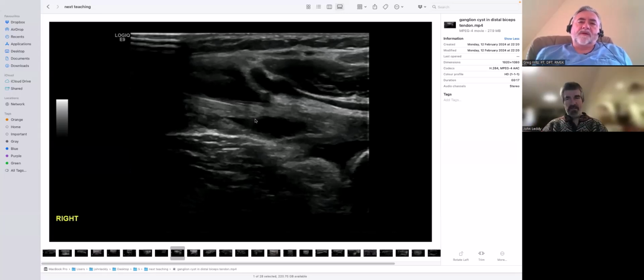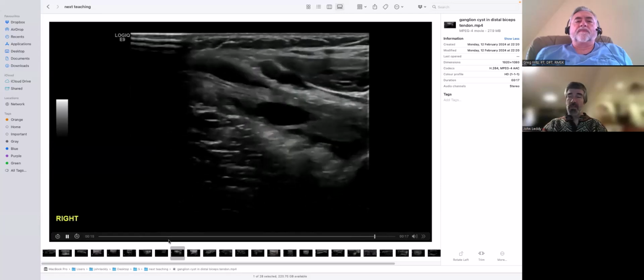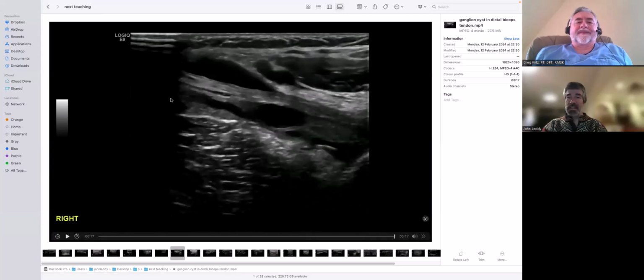That was causing an effusion in a patient. But in this case, I just don't know. I think it might be that the ganglion is leaking. It could be just the tendon's a bit swollen and there's friction somewhere, or it might be just the way the gods felt on that particular day.